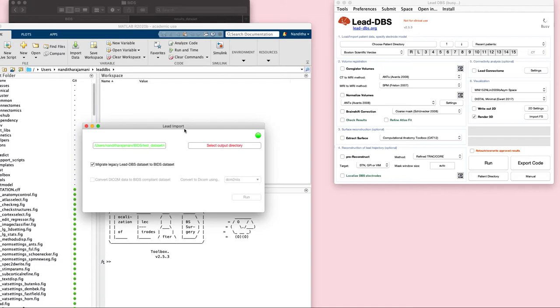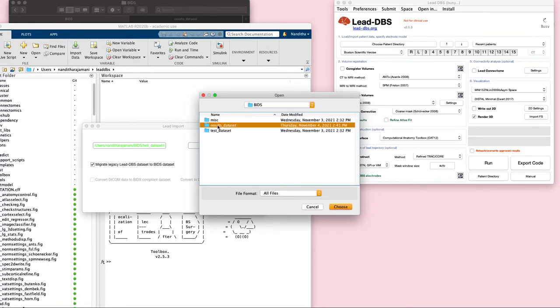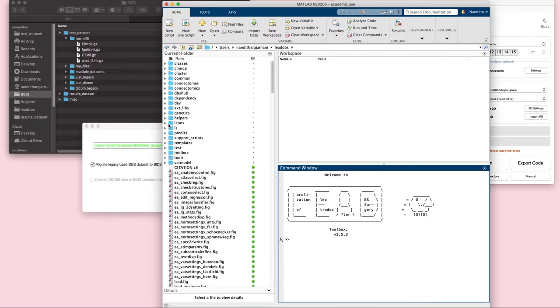The application already goes through your input data set and decides whether to migrate or to convert the DICOM data to NIfTI and NIfTI to a BIDS compliant dataset. Migration is an option for migrating your classic Lead-DBS into a BIDS compliant dataset. And this is of course automatically decided, but if you want to have user control over this, you can also do that by checking and unchecking both the checkboxes. And then you select your output directory, and now you can run this.